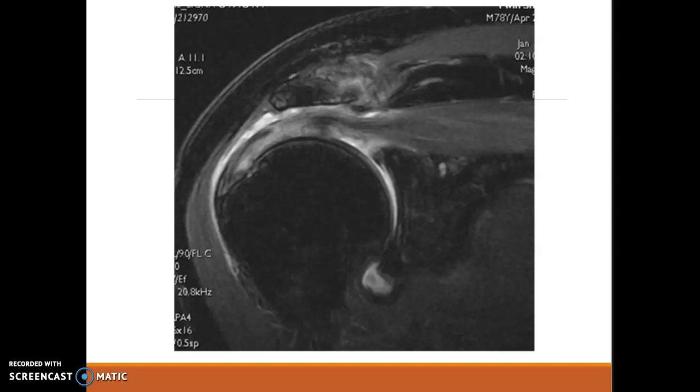And then looking at impingement syndrome, which can ultimately lead to supraspinatus tears. So looking at the supraspinatus itself as it comes up and over the humeral head, you can see the irritation and the subacromial bursa underneath here, where it gets irritated as the supraspinatus comes up and round. And as you can see here, the supraspinatus is running along here and then is getting irritated, so it dips down underneath here. So you can see how that is going to cause an irritation as it moves up and over and causes pain with movement.